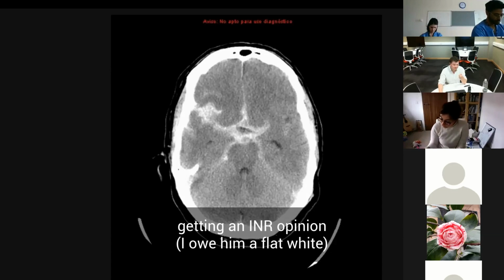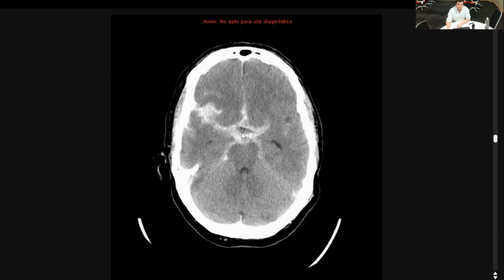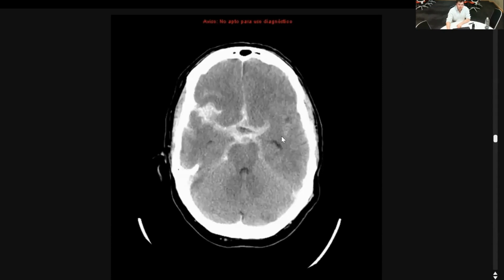You do a CT angiogram in every case of subarachnoid hemorrhage, unless it's a clear traumatic source and a clear traumatic distribution. But even then, you can think about it just to be on the safe side. If you look at the distribution of blood, you probably can make a guess on where most likely is the aneurysm here. Is MCA bifurcation, I guess. Okay. Yeah. So that's good. So this patient, guess what, didn't have their angiogram, which is annoying.